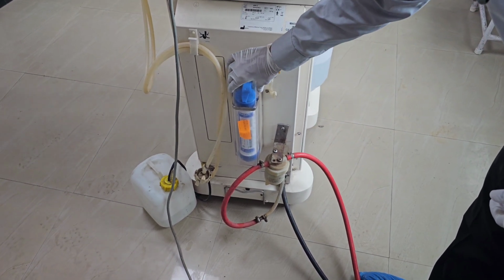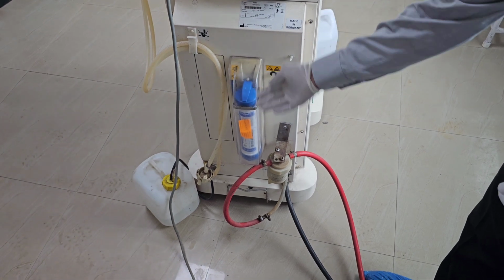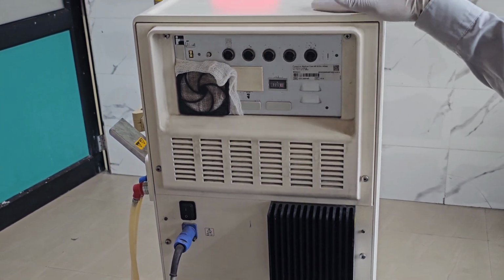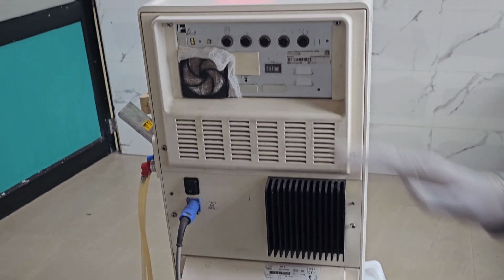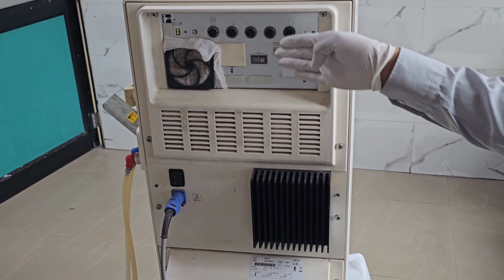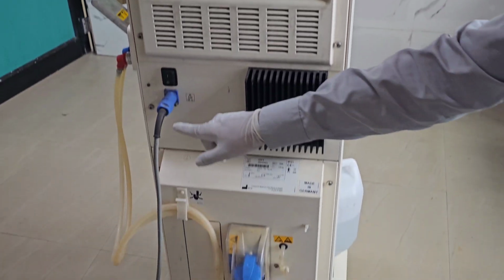This is a cover, you can say a case, for this diasafe so that it won't be dislodged while moving the machine. And here you have an air pump just for the functionality of the machine. It takes some air in, and apart from this, these are some hardware which is mainly for the dialysis machine operators or the engineers who come for the setting. There are some ports here. Apart from this, there is a power supply port.